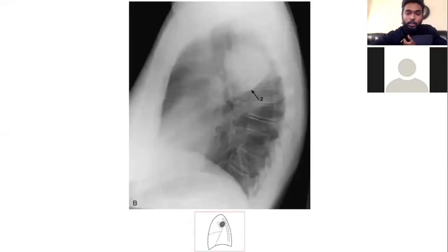But if you wanted to look here too, like I said, they give you a little diagram here. I said the horizontal fissure runs from... I'm not even going to count. I say this is the vertebrae. That would be the center point, right? Anything above this curves upward. Anything below this curves downward. You know what I'm saying? I'm going to say that's T5.